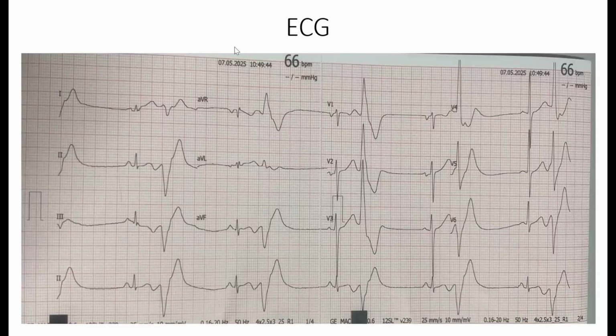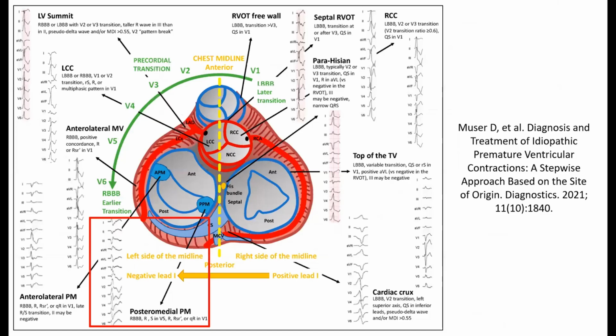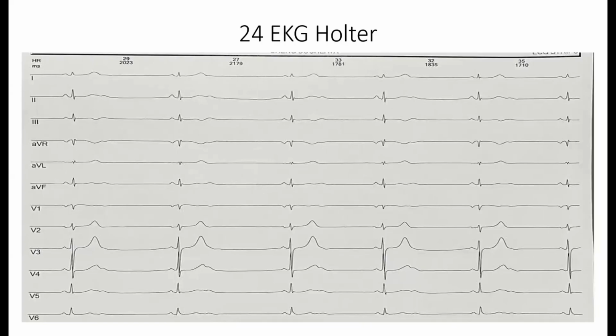As you said, this is the patient's 12-lead ECG. What do you see? Can you take a look at the 12-lead ECG? Show me the sinus rhythm ECG you showed to us. No, sinus. Yeah, there you go. What do you see here? What do you think is the most profound finding here? U wave, gigantic U wave. Do you see lead 2? Second hump?